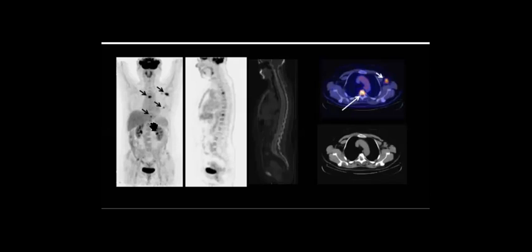And there is maybe hepatic. So hepatic, osseous, and axillary. And axillary, yeah. What is your differential? Okay, I agree with you that maybe this one is this one. Yes, maybe. Yeah, at least we have osseous and axillary lymphadenopathy.